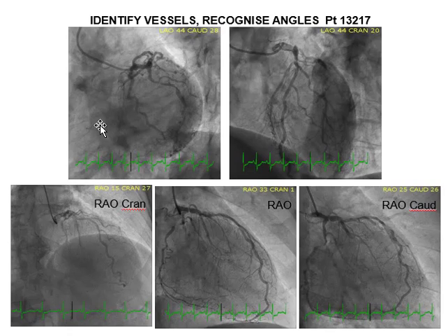Again, more views. Spider view, you should recognize that one by now, and I guess you could start remembering 40-30. Spider view 40-30, we've learnt that now. And the LAO for the LAD, LAO cranial, the heart is tilted forward. LAO cranial, the heart tilts forward, so you can remember that one. LAO 44, cranial 20, and that's the LAD coming towards you. We'll skip this one. I included it only to show you that you don't always get good images from the angiograms, and you just wear it. You either repeat the view or you just move on to a better view.